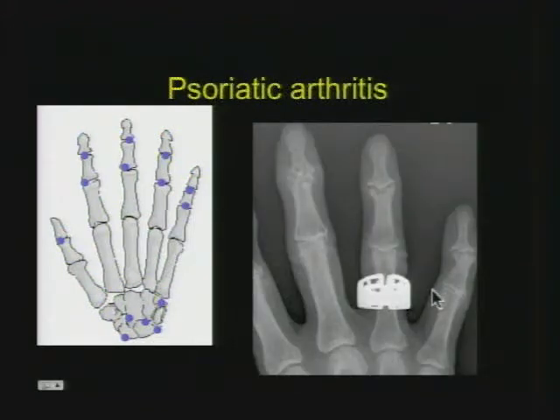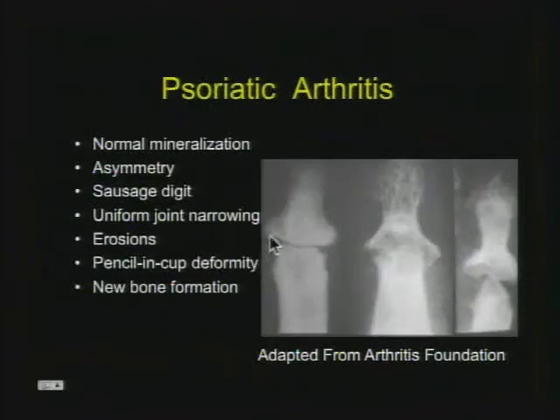So I have a little close-up here for you. It was bilateral, and it's DIPs. And you see all those little erosions. It's going all the way through the joint. It's not OA. It could be erosive OA. But some of the hallmarks are that you start to see fluffy new bone in the periphery. You get what we call Mickey Mouse ears, which I'll show you in a second, little cookie bites out of the periphery of the distal part of the joint. Eventually, you can involve the whole joint, and that's when it looks like erosive OA.